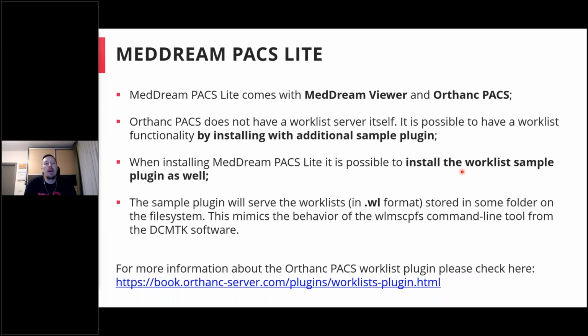And if you already have Orthanc PACS in your environment and are already using it, please check the official page on the Orthanc website about this worklist plugin. You will find information on how to set up this plugin, how to install it, how to enable it, and all this information. Basically, this plugin will serve the worklist files.